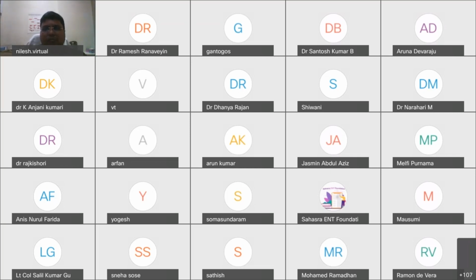Yes, somebody is asking about the foramen of Huschke. Sir, the foramen of Huschke should be dehiscent, then only it will be seen. I will try to incorporate it next time because I don't think I have any scan where it is dehiscent. Unless it is dehiscent, you cannot tell that it is the foramen of Huschke.